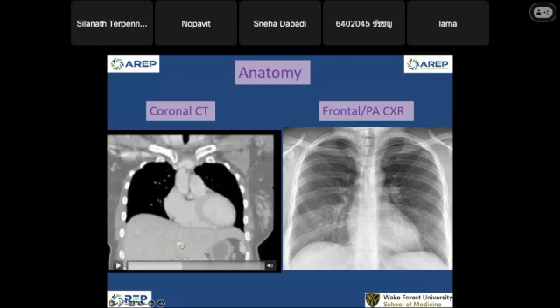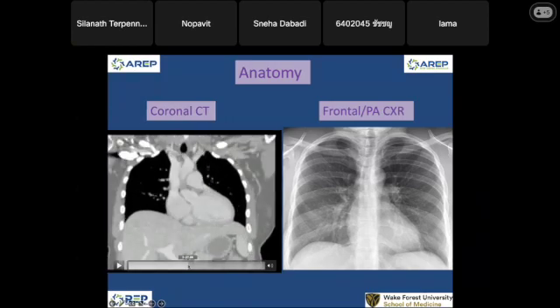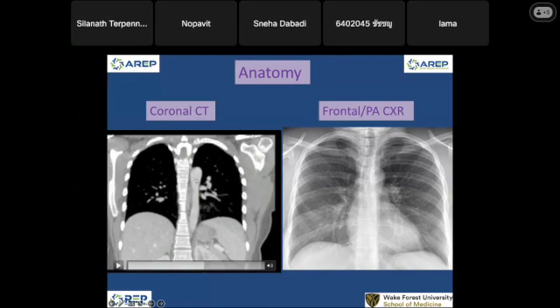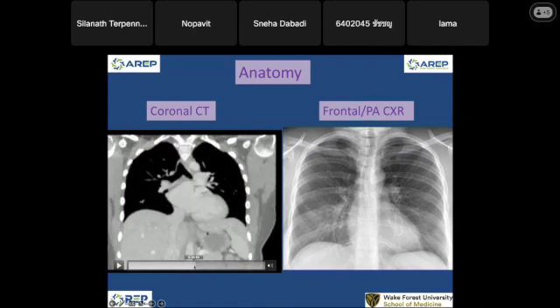Okay, this is the portal vein in the liver. The liver has dual blood supply. This is the portal vein. This is the main and the left and the right portal vein. The liver looks good. And then you see, this is my descending aorta. Descending aorta coming down, supplies the belly.